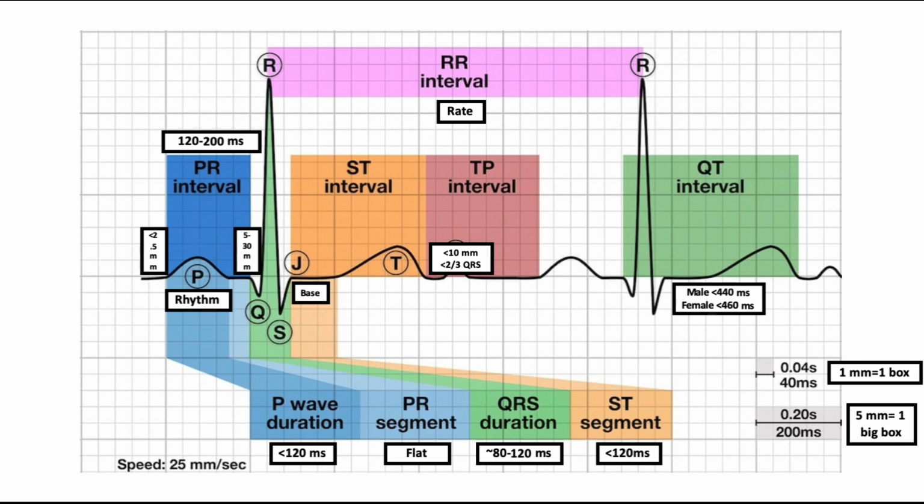Now, here is your summary of all of your different changes that you have on there, your different measurements, what the specific points or segments should look like, and you can use this to make sure that you're well aware of each part of the QRS complex, the P waves, T waves, and their relationship with one another, to make sure that you're following that entire course of the cardiac cycle, from depolarization of the atria, signaling down to the communication with the ventricles, and repolarization of the ventricles that help you determine if the heart is functioning normally.